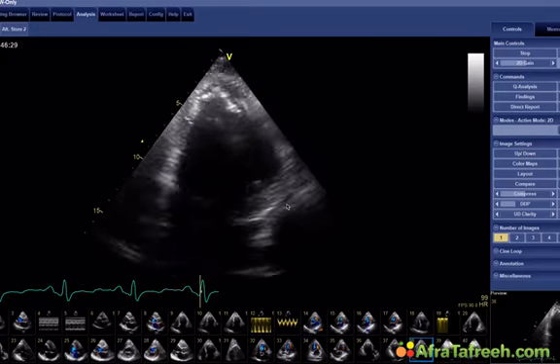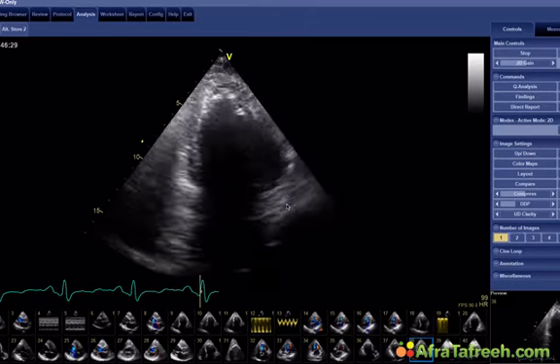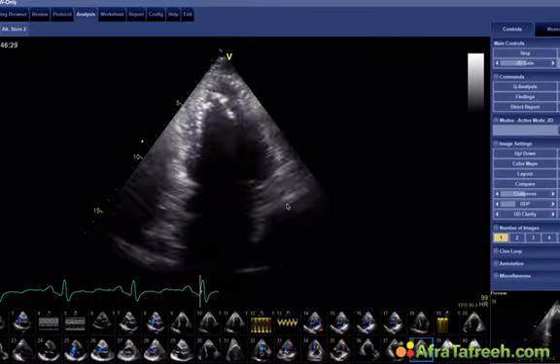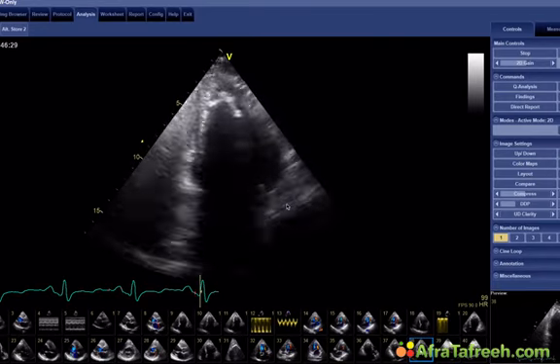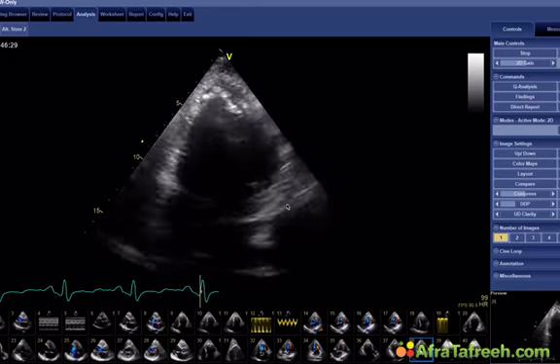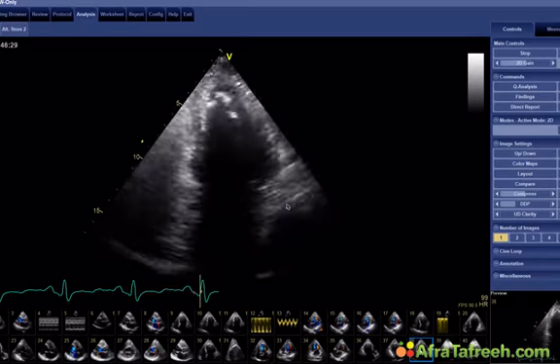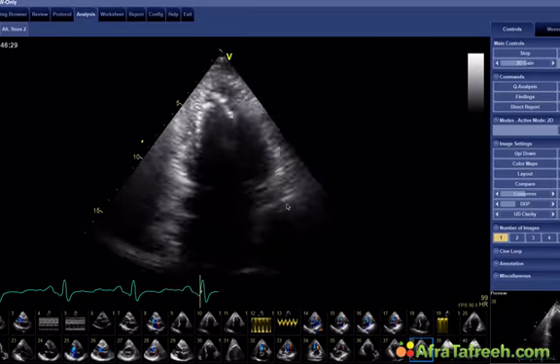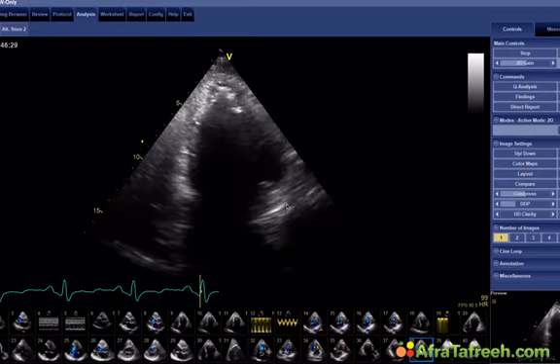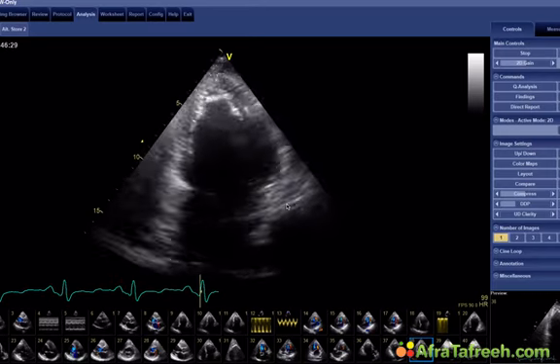So what we did was we brought the patient to TEE. The only problem was that the patient was so dyspneic at that time that we were not able to perform the TEE study. So we just simply sent him right away to surgery and said, okay, we'll do the TEE study during surgery. The anesthesiologists do that, and they will see what the pathology is like, and they can then obviously operate. In addition, obviously, the surgeons will take a look at the valve as well. So he was operated, and yes, operation went fairly okay.